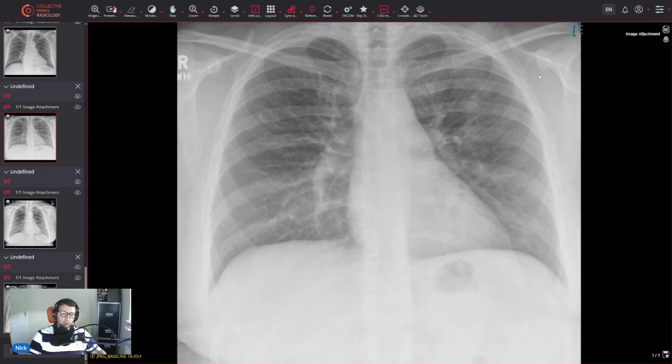So really important for you student radiographers, rad techs: if there's a hair plait, make sure it doesn't overlie the chest. Similar with any other external artifacts, because they're really easy to miss, but otherwise this patient could go on to have an unnecessary dose of radiation because we don't know what it is. They could end up having a repeat chest x-ray unnecessarily. So it's really important to try and get that out of the way. Or if you do an x-ray and you think, oh no, I didn't see that, at least label it or write a comment so that we know exactly what it is.